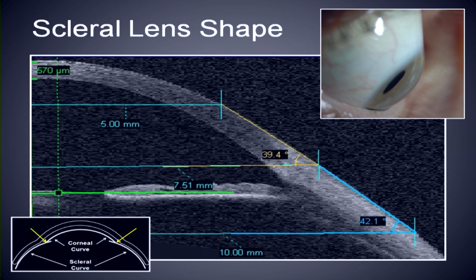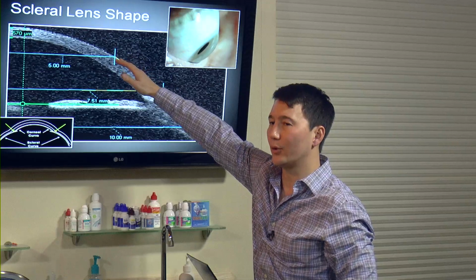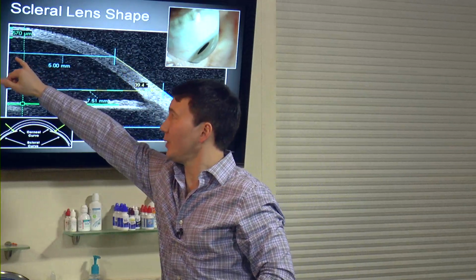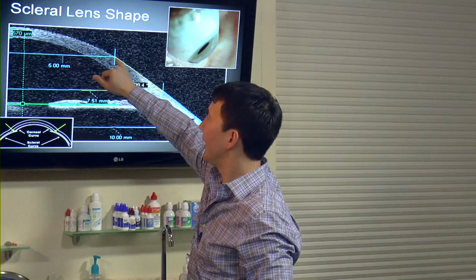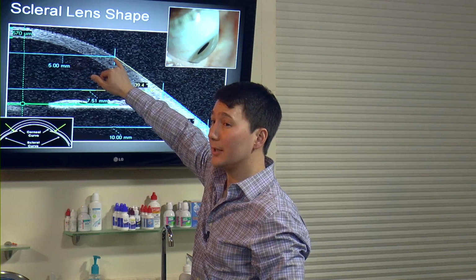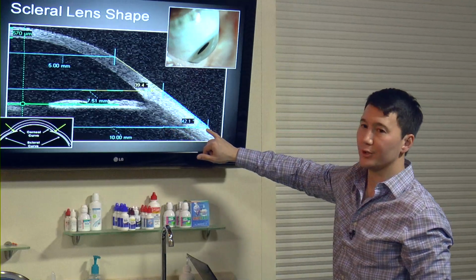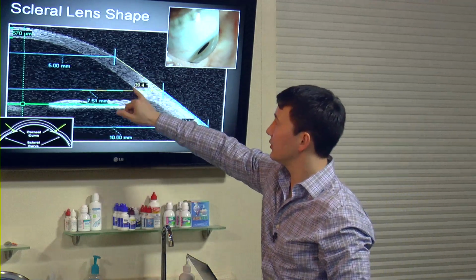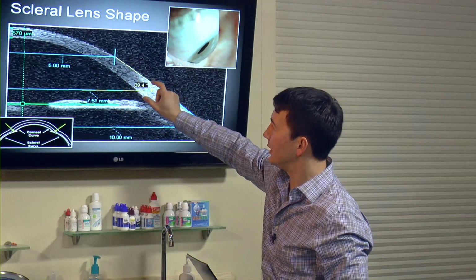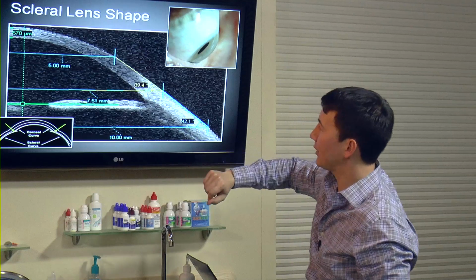One of the first studies that we did was to use the OCT and observe what's happening beyond the cornea. So imagine this is 10 millimeters diameter across the cornea. And at around 10 millimeters, the eye begins to form a very straight line or tangent shape. So the eye actually has no curve through the limbus. You can see the limbus is somewhere in here where the density of molecules is very white, and then you get that grayer or blacker area.